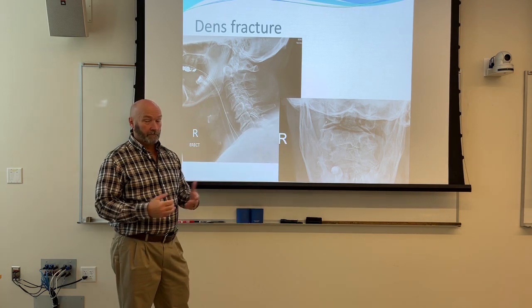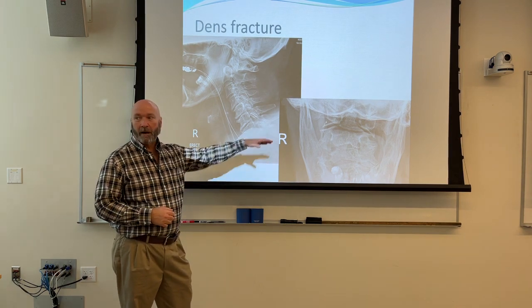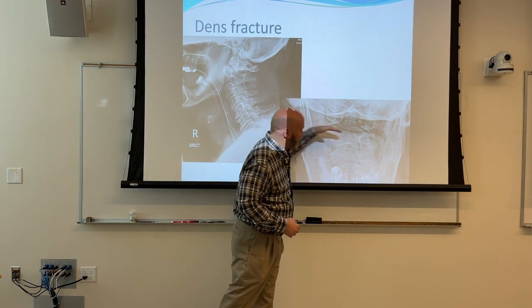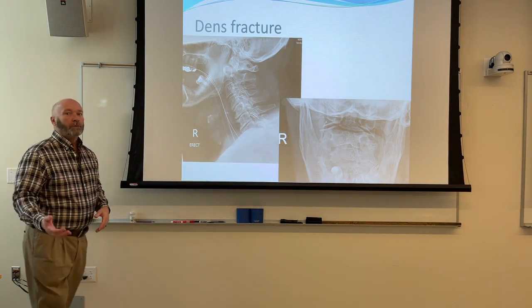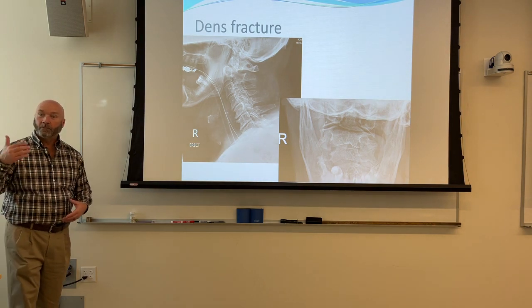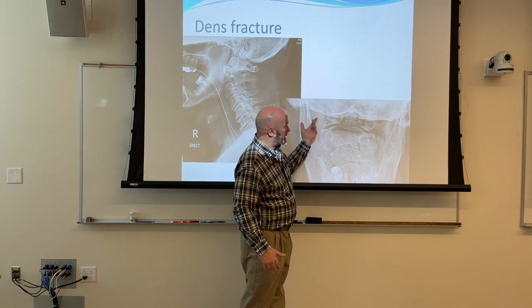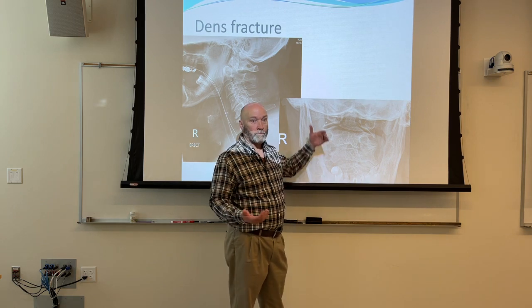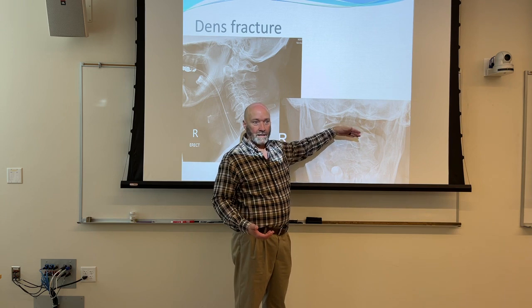If you've got a fracture with displacement, do you think it's important to be able to catch that? Now you've got a bobblehead, right? The entire odontoid process is snapped off at the base. So what I'm trying to get to here is, don't do that. We've got to have a good open mouth odontoid. Even if, I mean, this is not perfect, right? That's the base of the skull going across it, and you don't see the teeth anywhere. So this is poor positioning, but can you see what the problem is with this patient? The answer is yes, you can.